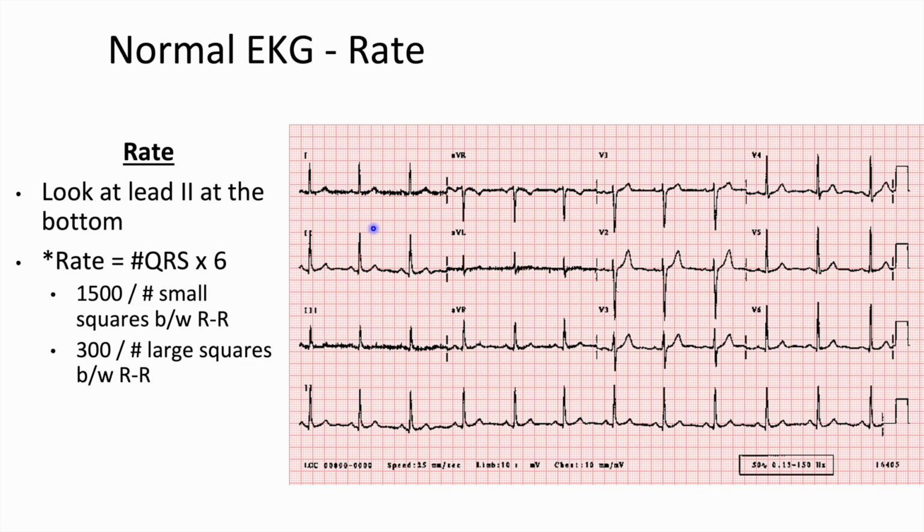If you need to calculate it a different way, for example, if you don't have a rhythm strip, you just have this small segment, then you can do it one of these two ways.